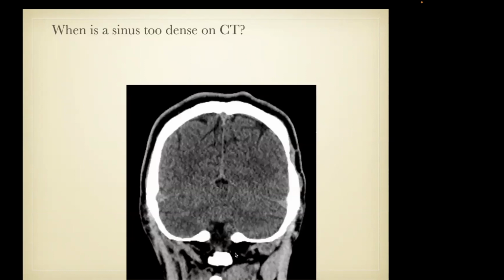You can measure the sinuses, usually on a coronal reconstruction, which is an easy way to measure the attenuation of all the sinuses, the superior sagittal sinus and bilateral transverse sinuses, by simply putting a cursor on your PACS workstation. You can do this routinely in your practice just to get familiar with this approach and to look at the density of the blood in those vessels.